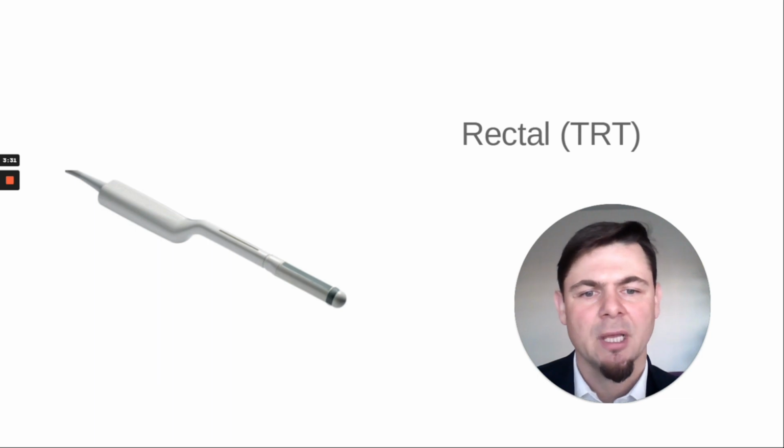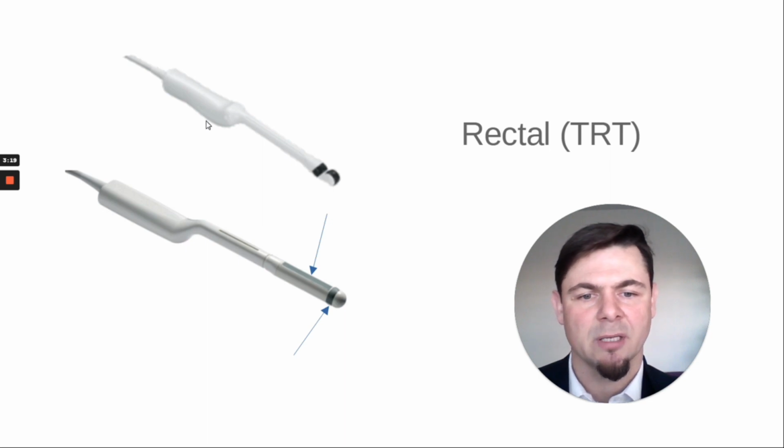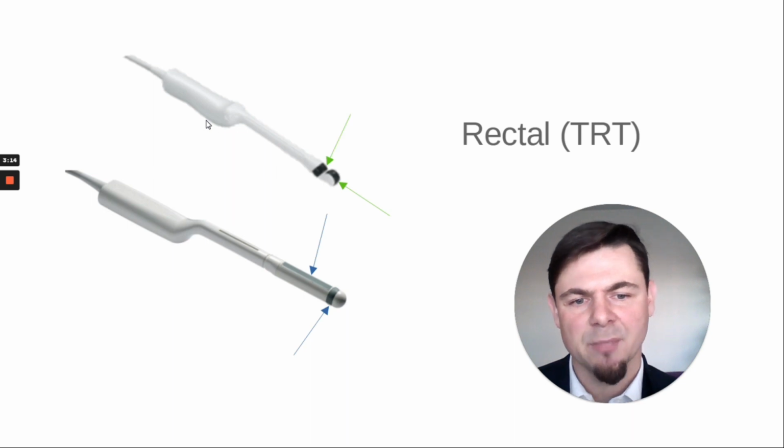Transrectal probe, TRT. It has two acoustic lenses, often in the arrangement of a linear probe and a convex probe. There is a variety of TRT probes on the market, depending on the producer. They have different lengths of arrangement. It can be convex-linear or convex-convex. Mainly used by urologists for prostate examination and biopsy, often with a biopsy attachment. Frequencies are more or less from 2 to 12 MHz for convex and up to 13 MHz for linear probe.